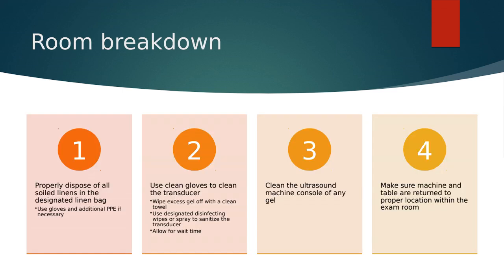Next, we're going to do our room breakdown. So we're going to go back in, make sure everything is thrown away. So we're putting all of the dirty linens in the linen bag. We're using PPE when we're doing that. It's just put gloves on. When in doubt, just put gloves on.